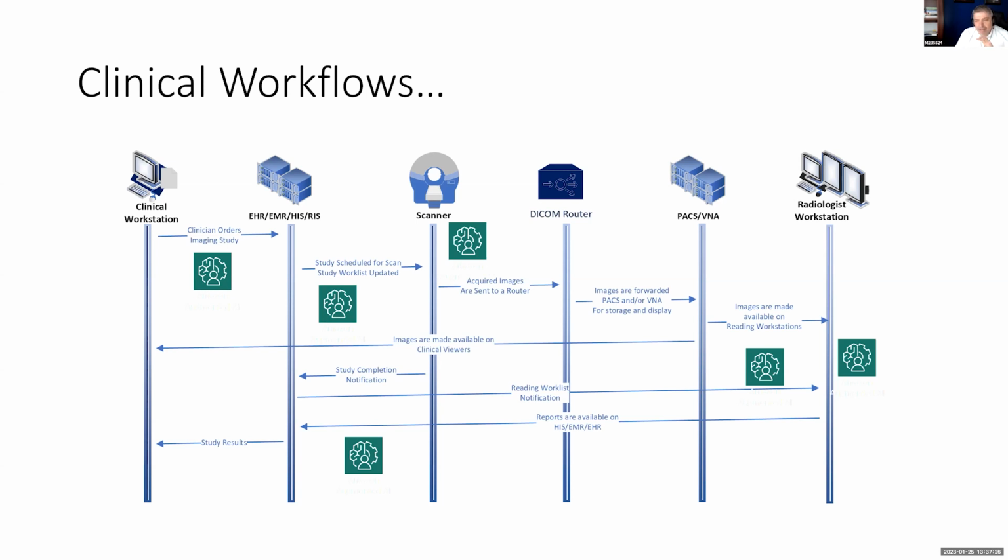So the reason I cover that, if you look into the traditional radiology workflows, is that for MONAI Deploy right now, our current focus, at least for today, is everything in between the order creation and the report generation. So we won't be covering decision support systems.